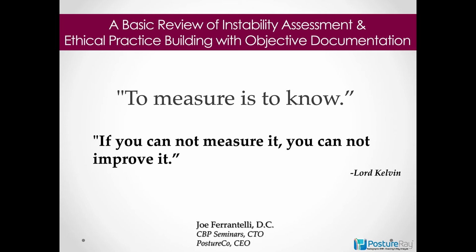Hello, this tutorial is for just a real quick basic review of instability that most of you should already know. I just wanted to make sure that we're all on the same page and how PostureRay addresses this.